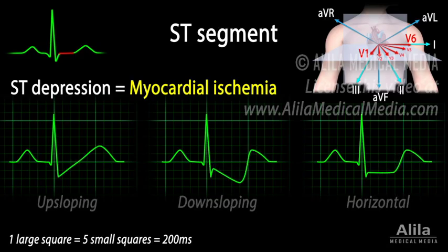ST depression may be of various morphology and may be seen in a variable number of leads, and therefore cannot be used to localize the lesion.